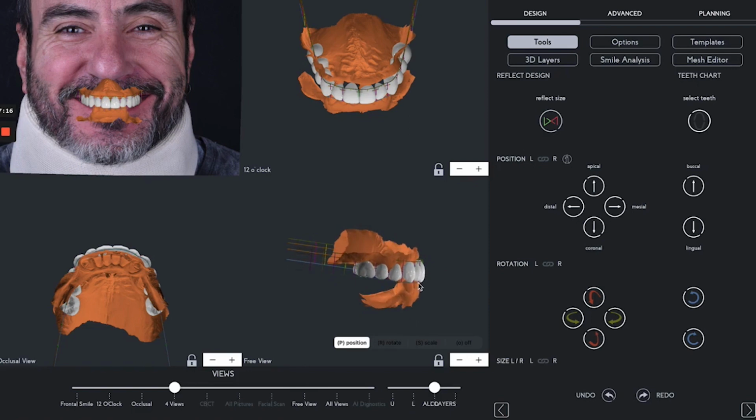But beginning here with the upper, I already preset the occlusal plane. Notice here that it needs to be rechecked later with the dental technician in his own lab software, but for us as dental clinicians, it already gives us a better understanding on the aesthetics and the proportions of the design as we are studying and making the analysis here.